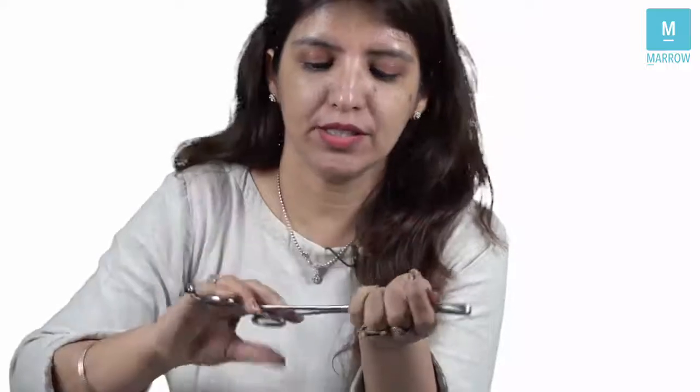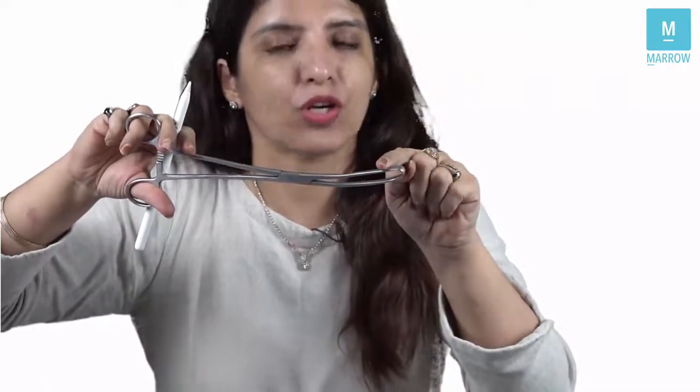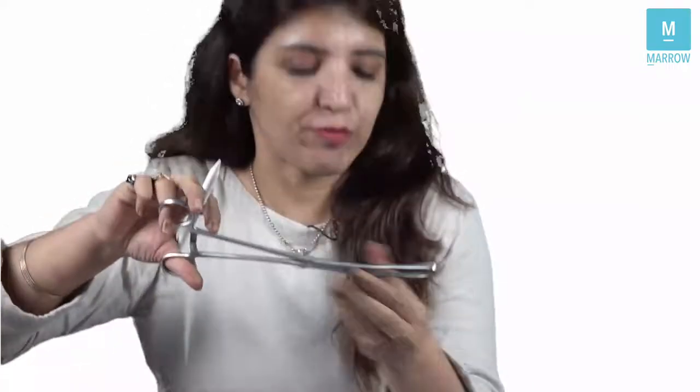So, this is the instrument. Again, you have a ratchet lock. Then, at the anterior end, look at the blades. They are curved. That's a concavity which is present there. This concavity, I'm just now going to apply it and show to you that when you are going to apply it, the concavity should face upwards, right? So this concavity should face upwards. Then on opening at the tip, you see 4 to 5 rat teeth.